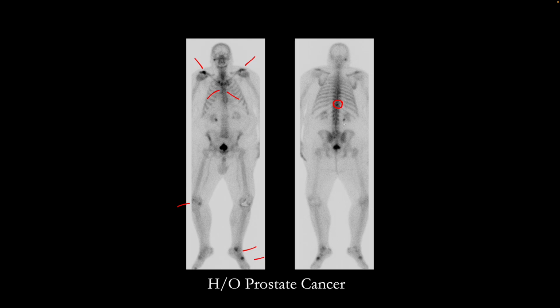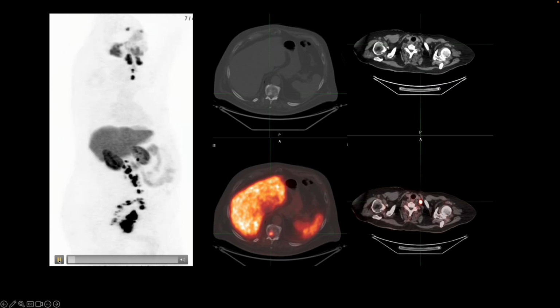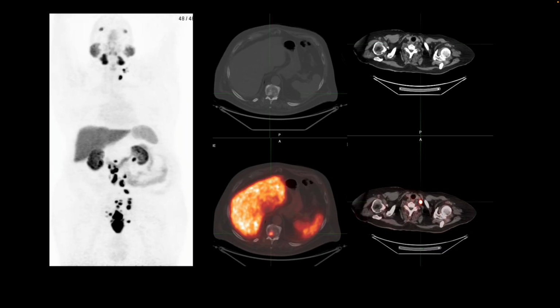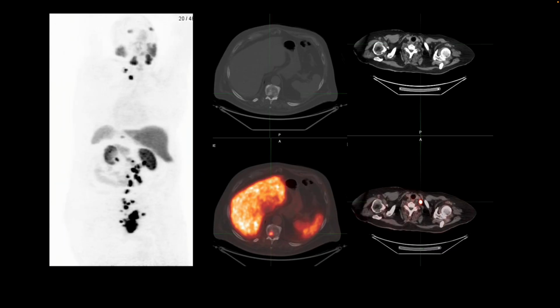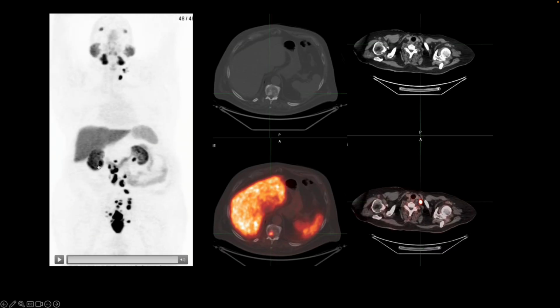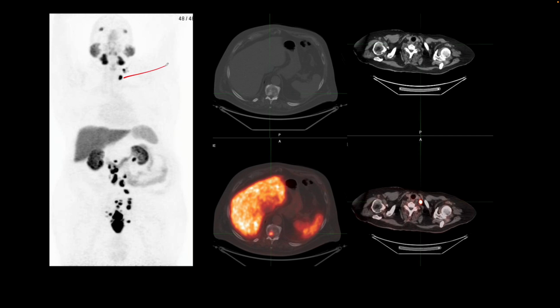And this patient underwent a follow-up PSMA PET-CT. So on the PSMA PET-CT, we'll start by looking at the rotating image. We see extensive metastatic disease, which is PSMA avid. Most of it is in the soft tissues. That is why it's not seen on the bone scan. And the interesting finding here is this Virchow's node, which is in the left supraclavicular location, which is PSMA avid.